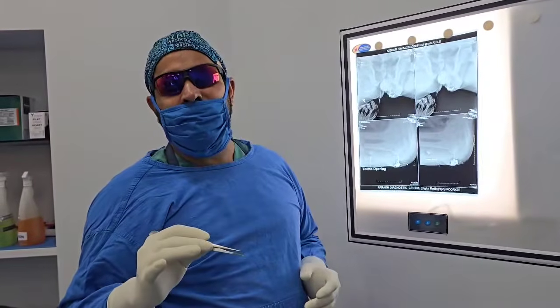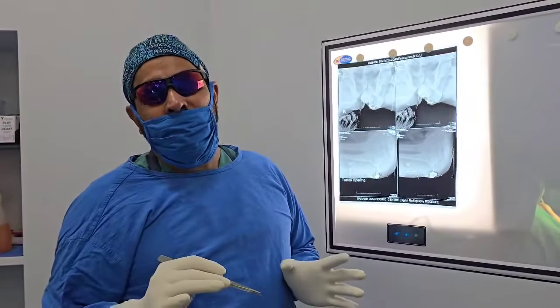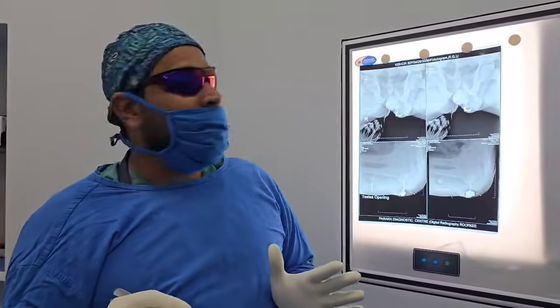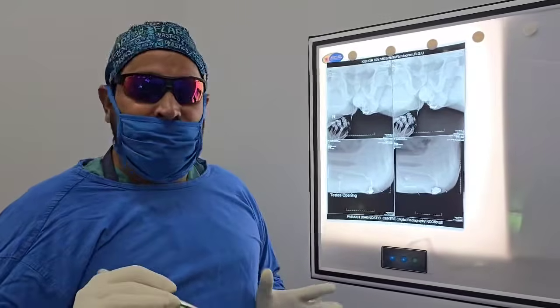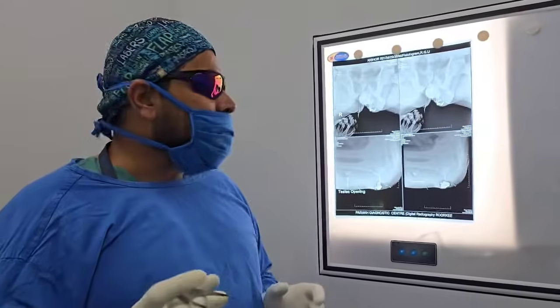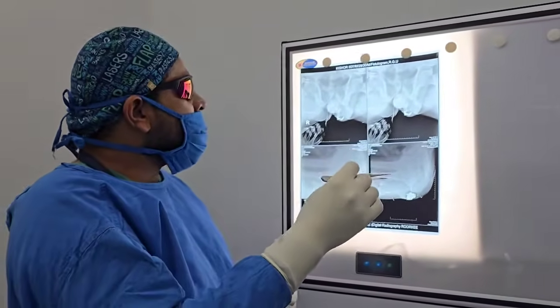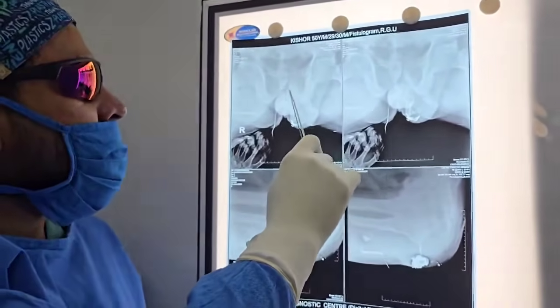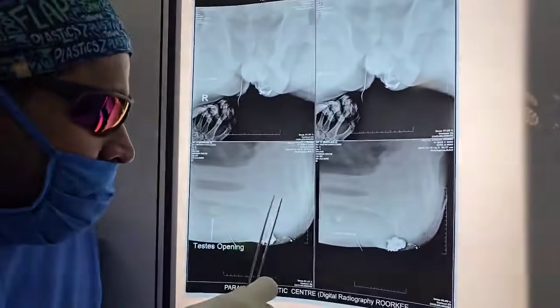This is Dr. Sachin Gupta again with a presentation of a very complex case of scrotorectal perianal transsphincter fistula. It is basically a horseshoe fistula. This is a very clear fistulogram. You can clearly see these are two views, one is the anterior and another one is the posterior view.